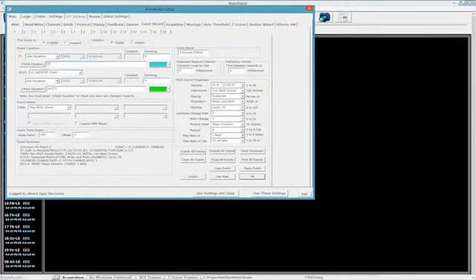So I'm going to go x equals 5. I always check my equation. And I'm going to do damping of 15 right here. And I'm going to do the same thing. Well, let's actually do this a different way. I know I'm changing things on the fly.